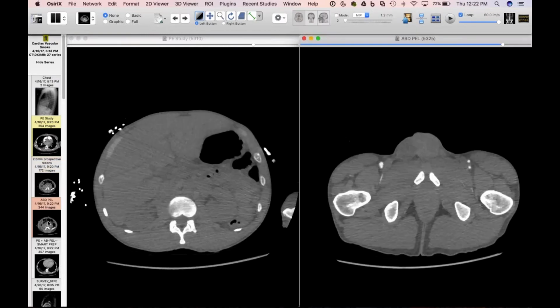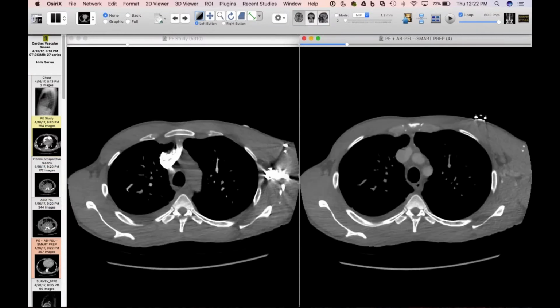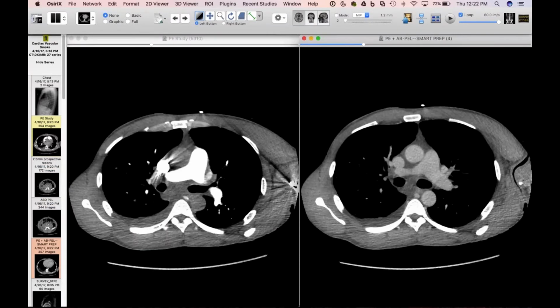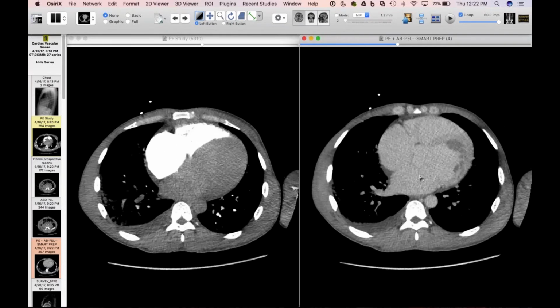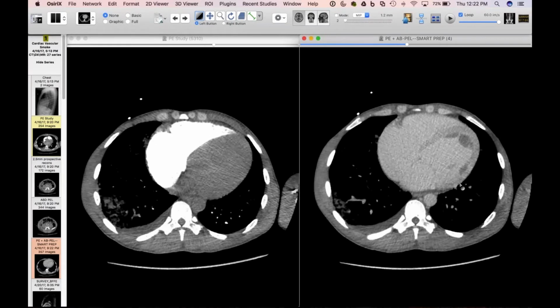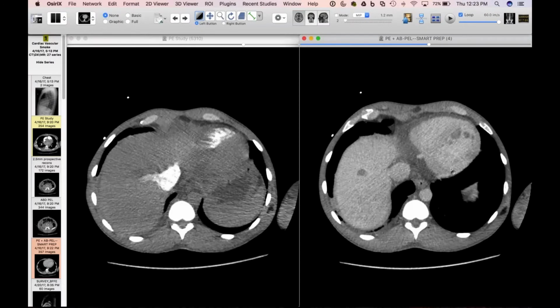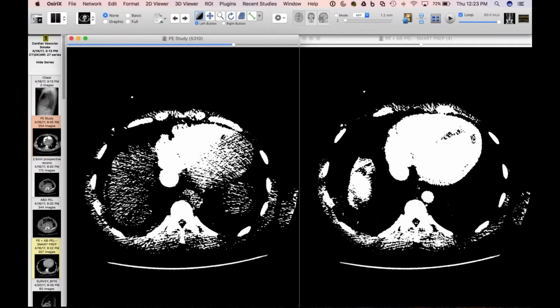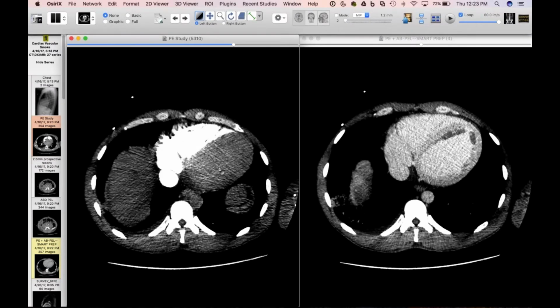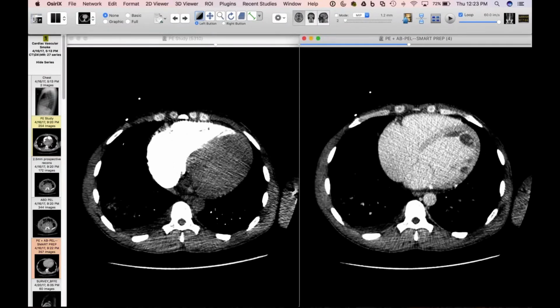And there may actually be an arterial, or maybe it's a venous phase through the chest. Yeah, they did a venous phase through the chest for I don't know what reason, but I'm glad they did, because he also has some thrombus in his left atrium here. But this is like the most extensive clot I've seen in quite a while, all hidden on this PE study just because of our timing of contrast. Maybe you can window it down and hallucinate, but no, probably not. So I thought this was pretty impressive.